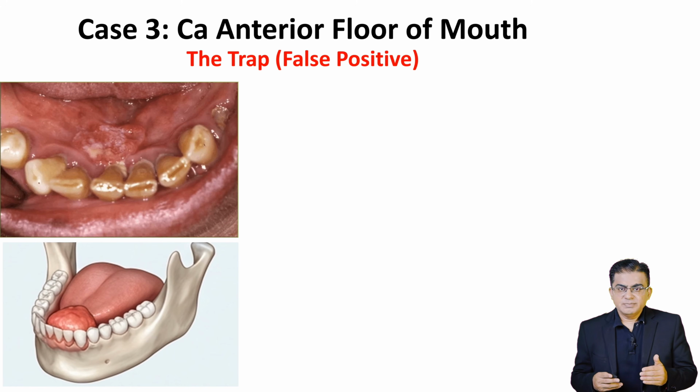So we have this young patient with a carcinoma of the anterior floor of mouth. See here. And this is how it looks on the diagram. As you can see, it is abutting the central arch of the lingual surface of the mandible.